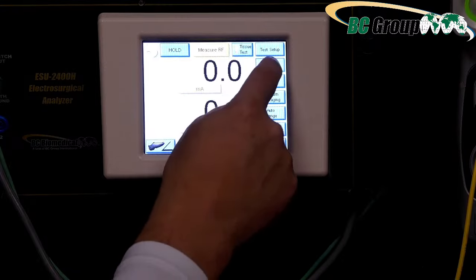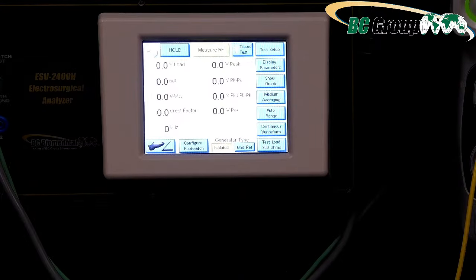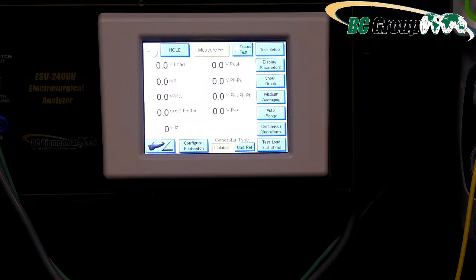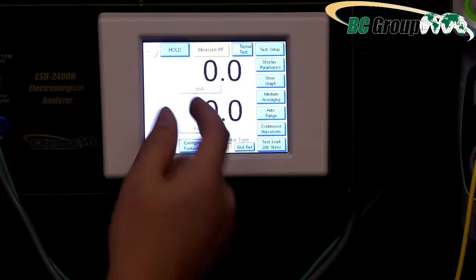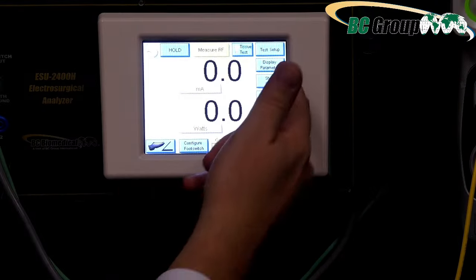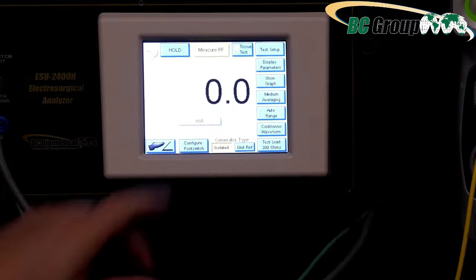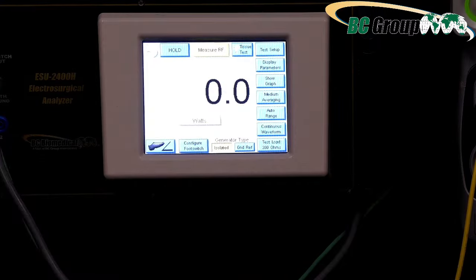We can run a lot of readings, all readings. Look at all those numbers. If you're doing a calibration, you can see all these numbers all at once, and they're reasonably large numerics. So if you want your numerics to be larger, like here, just run fewer of them. But for the most part, we run 1. And you can see we have it on milliamps. Most ESUs are going to be in watts. Super easy, touchscreen.